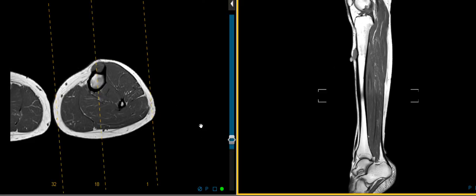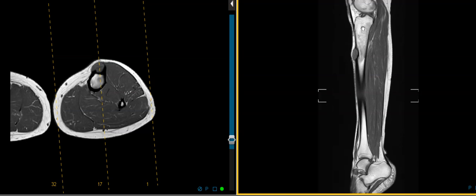This is a T1 weighted image where fat is bright. So we see high signal within the marrow, high signal in the subcutaneous soft tissues. Muscles are intermediate to low signal here. These are the calf muscles. This is the heel, the calcaneus back here. You can see the Achilles tendon just to get oriented. We see this lesion is in the proximal tibia, and it's not within the medullary cavity. It is associated with the bony cortex or periosteum here. You see the dark band is the cortex, and that's scalloped and pushed down, has sharply defined margins.